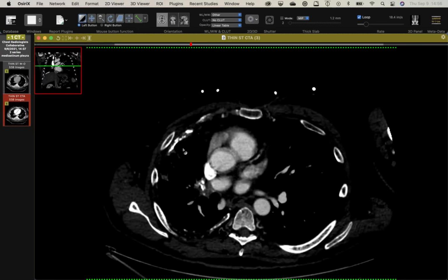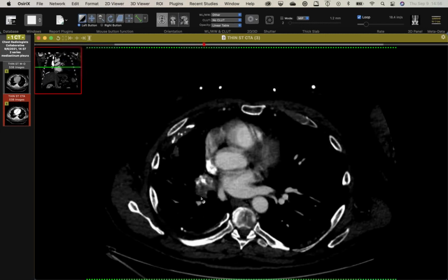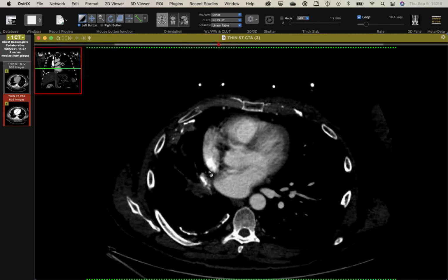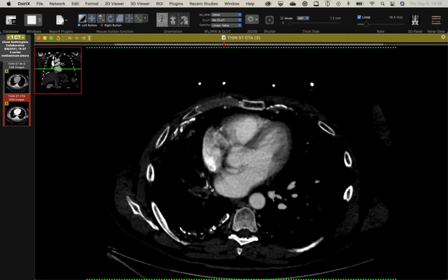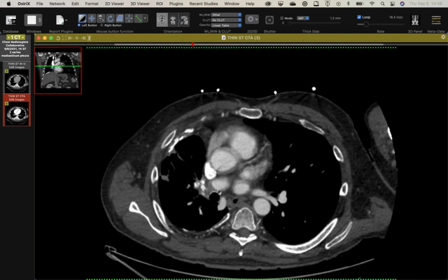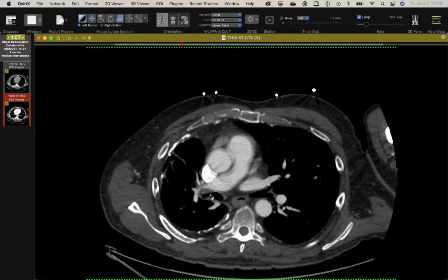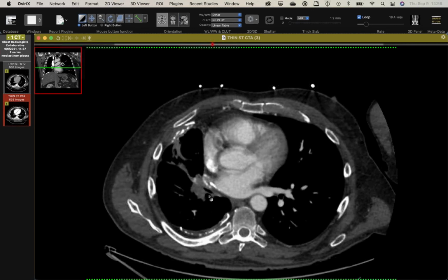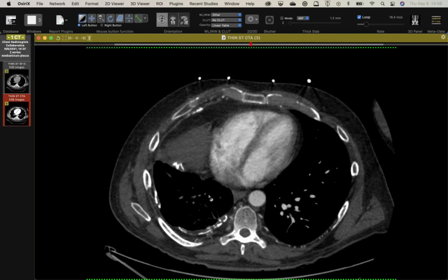And this one's a little interesting in that it just took out this entire pulmonary artery right there. And the vein somehow managed to, at least. How is the vein filling? What is filling that vein? Well, there's got to be some collateral flow through something. That guy from the bronchials. Yeah, there's some bronchial, or just the spontaneous systemic venous collaterals that occasionally develop. Yeah. But yes, that's a really good question.